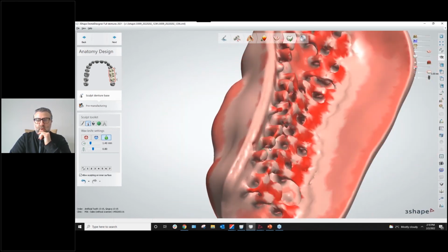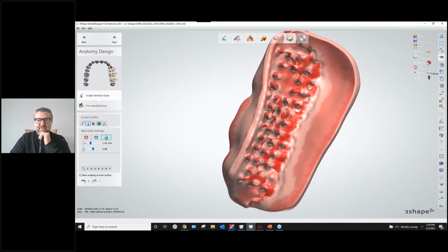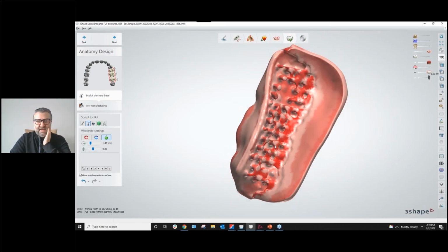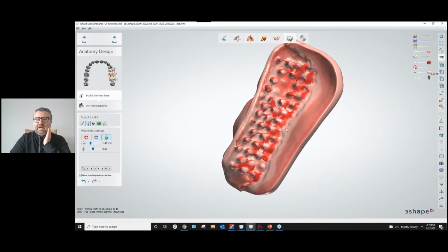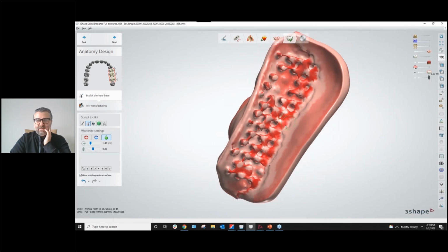So why I like doing this digitally, it's because I can activate the minimal thicknesses over here, the mapping of the minimal thickness. Yes, some of you will say, well, I can just grind it by hand. Yes, you can, not a problem. However, digitally, you will see the minimum thicknesses when you're going in or out of your material.